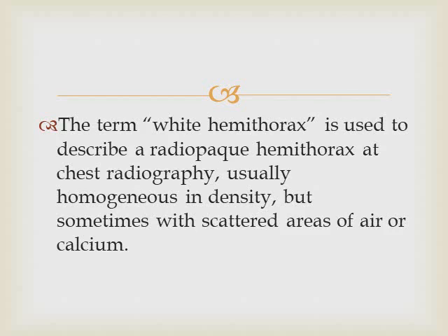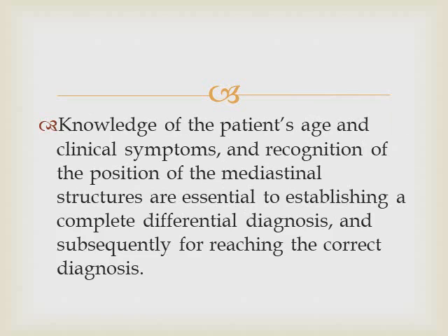Today I am going to discuss white hemithorax in children. The term white hemithorax is used to describe a radio-opaque hemithorax at chest X-ray, usually homogeneous in density but sometimes with scattered areas of air or calcium.